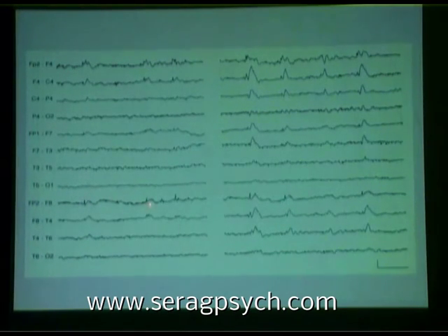But then they keep coming, and they keep coming, and they keep coming. And look at this. It gets more and more, and they're more spread. And what's the difference between this section and this? This patient is more drowsy and so those spikes just got more and more prominent. So don't ignore those little things, because they could become real spikes later on.